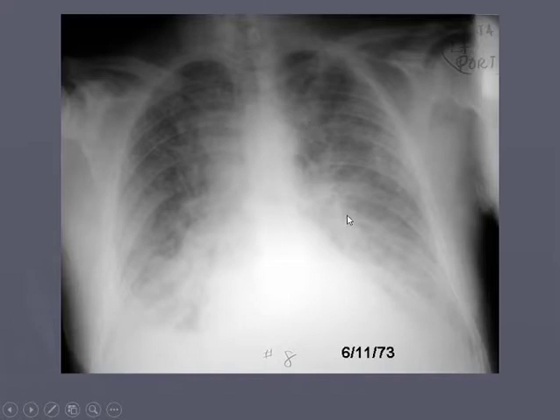Let's see here. Cardiac. Hard to tell where the heart begins and ends, doesn't it? Because it's just kind of fluffy. But you can see the pulmonary arteries are very engorged. There's one, there's the other. This looks flat across, but again, remember that the guy is twisted. So when the guy is twisted, it's kind of hard to tell.